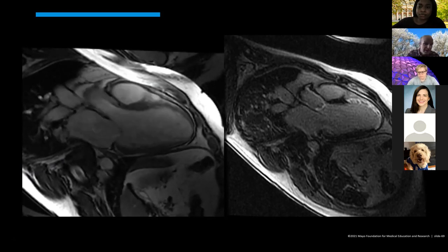In these areas of microvascular obstruction, it is so obstructed due to necrosis, edema, hemorrhage, that the gadolinium doesn't have enough time to get to that territory to give you the enhancement. So it's just an indication that the infarct is really, really bad, very, very poor prognosis. The prognosis was already bad because it was transmural. It's just even worse because you see the microvascular obstruction.